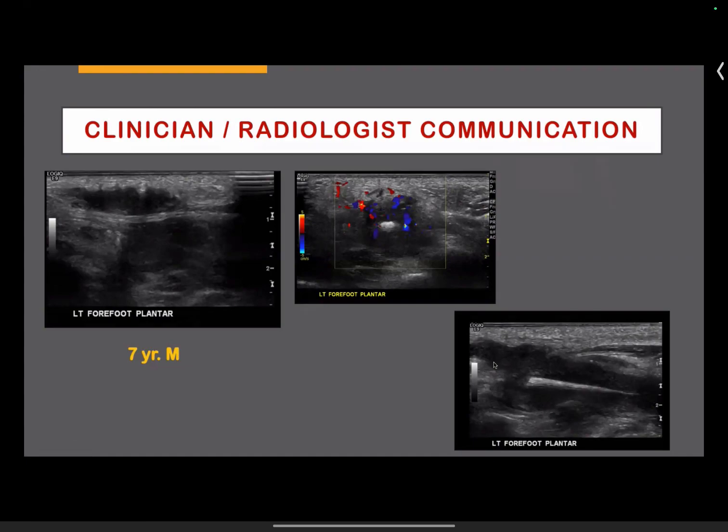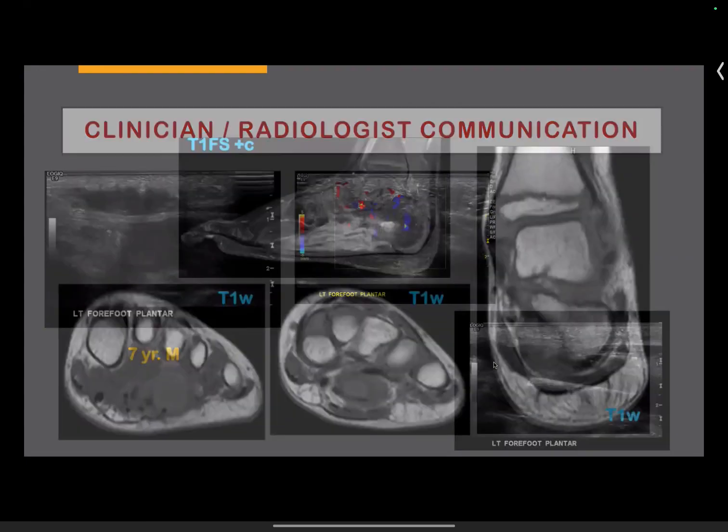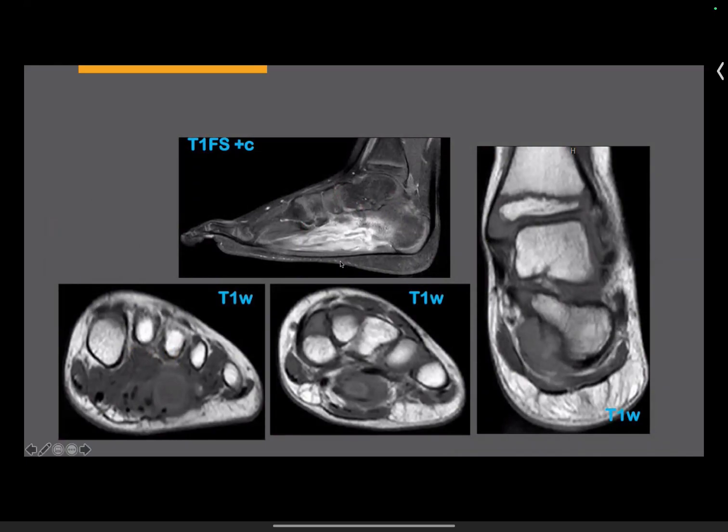So then we raised that this patient could have osteomyelitis of the calcaneum. And lo and behold, when we did the MR, you can see there's a tract which is enhancing. There is enhancing marrow edema in the calcaneum. And the other sign, which I'm going to show you a few times in this talk, is quite pathognomonic of an abscess, which we call a penumbra sign, whether it's in the brain or in the muscles or in the bone for that matter. You have to give adequate importance to that.